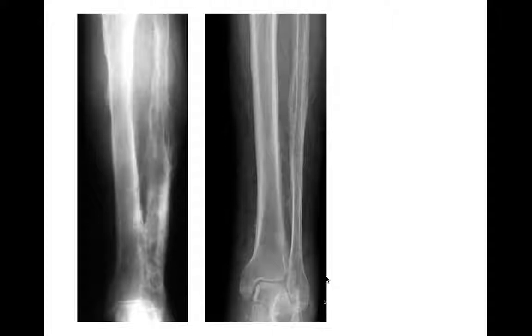Here's a more typical case of periosteal reaction from venous stasis disease. This is a more solid periosteal reaction along the fibular shaft and to a lesser degree along the tibia, both due to venous stasis. The previous one looked a little more bizarre. This one is more typical of benign or solid-appearing periosteal reaction in venous stasis. Can I tell you for sure that this is venous stasis? No, there is a differential for this, but this is one of the more common ones that causes this. So this is venous stasis.